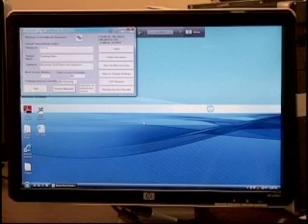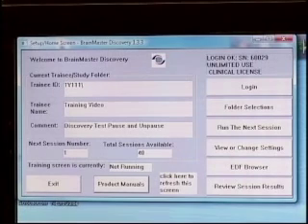Okay, before the client comes in, I want to review some of the settings which you may want to look at. It's not necessary to change any of the settings. Right now we are ready to record full 19 channels and all the defaults have been set. But there are a few things you may want to inspect, and to do that you will look at View or Change Settings.